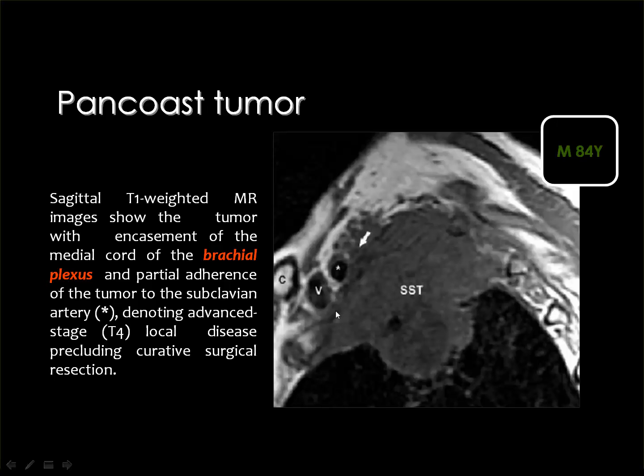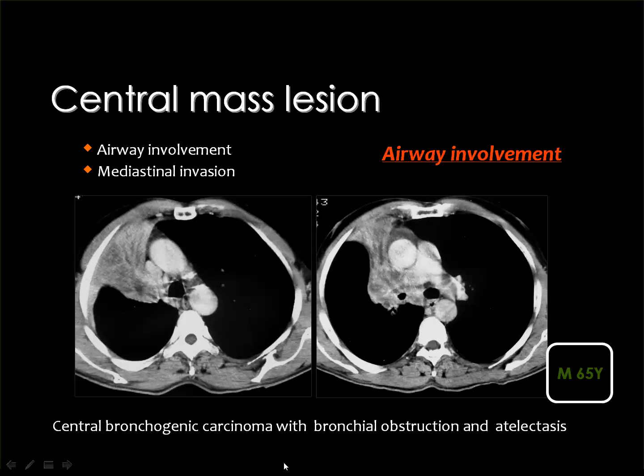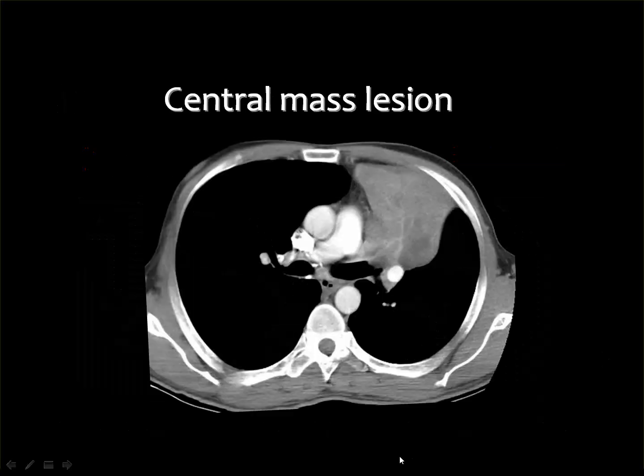And you can see here, this is the Pancoast tumor, and this is the site of the brachial plexus, this is the subclavian artery, and this is the subclavian vein. Any invasion of one of these three structures will contraindicate surgery. Then in cases of a central pathology, you have to discriminate between the tumor mass and the associated consolidation, especially whenever you are going to have a CT-guided needle biopsy. In such conditions, you should go by the needle as deep as you can to reach the tumor tissue and not to take the biopsy from the consolidated lung.